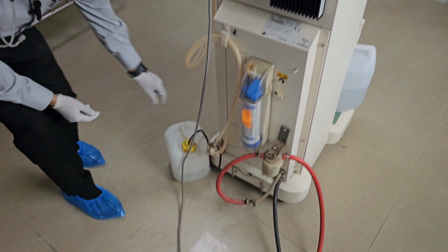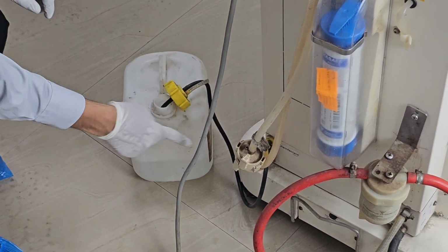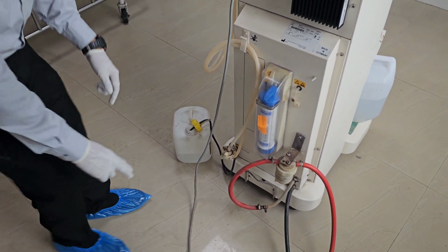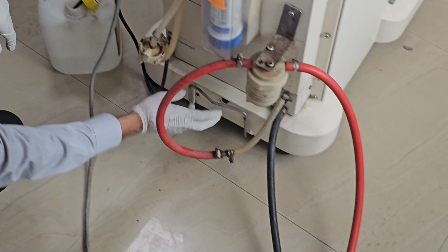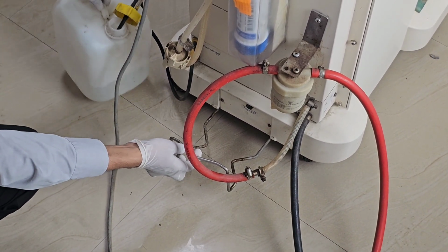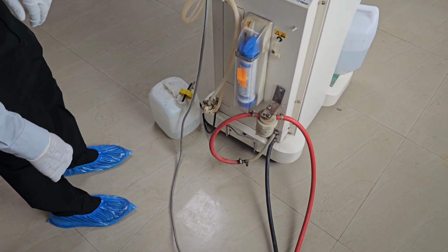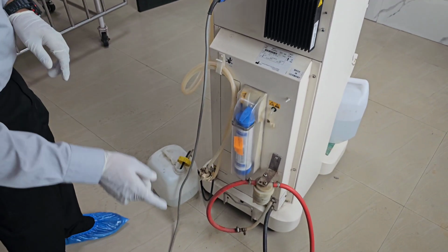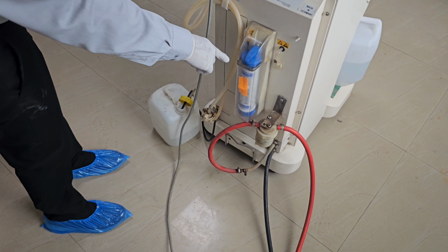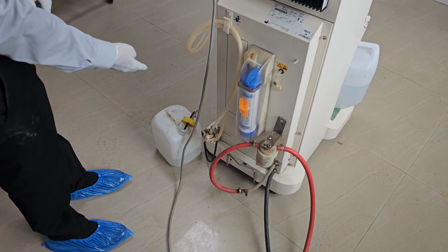And what is this can? One can is kept over here, and one tube is also connected. This is the citric acid can for cleaning the machine, and this can be kept in the holder. There is a holder for this, so that while moving the machine, this can will also be moved. So on the back side, the important parts are: one is for water entry, one is for water exit, there are water filters, power supply, and one is for cleaning, which is the citric acid can which is connected.